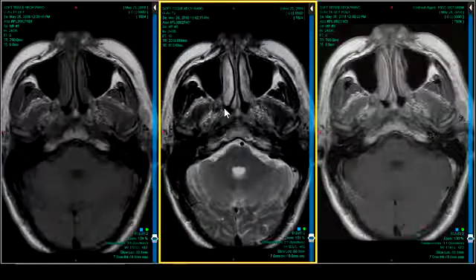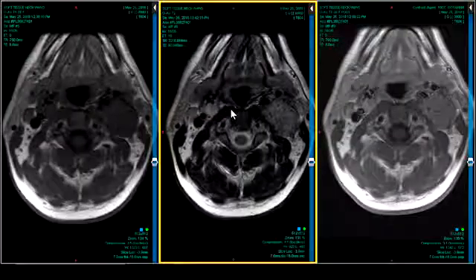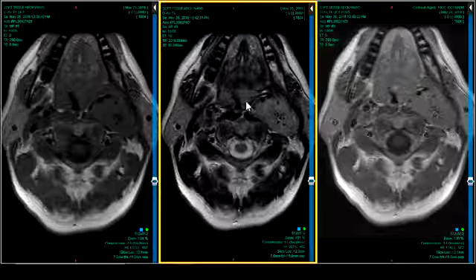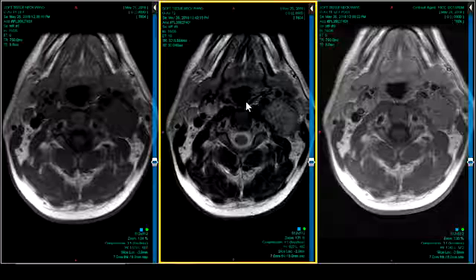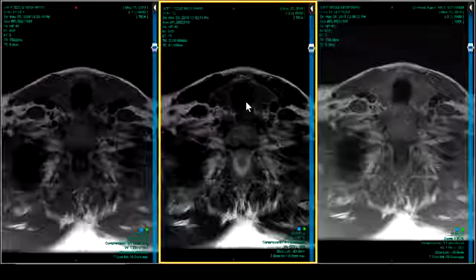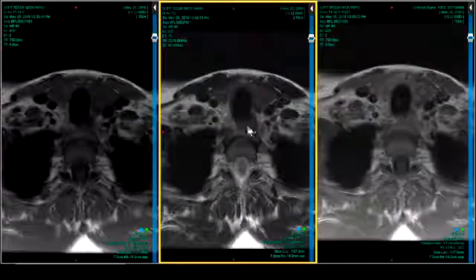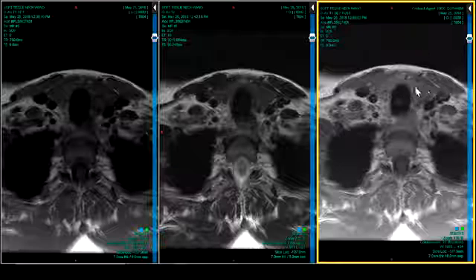You get so enamored with the love affair that you're having with the glomus twins, they're back again, it's a fantastic case. It's an amazing diagnosis. It's beautiful in terms of the imaging. I know that sounds crazy, but that's who we are, radiologists. This is true beauty in radiology. And then we get down low, and we forget to finish the search. And lo and behold, that is not a normal thyroid right there. Look at it really carefully.